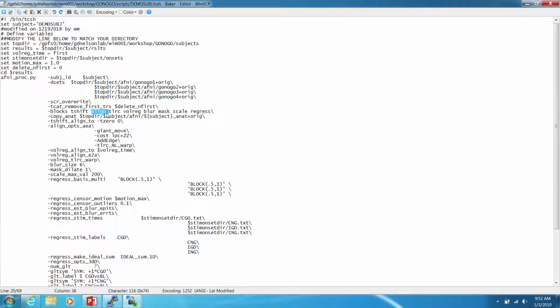So this is a high resolution image that shows us more of what the brain's anatomy is. So we use that anatomical image to help move our individual subject's brain, which has its own particular shape and characteristics and size and thickness of the skull and all of these other characteristics.